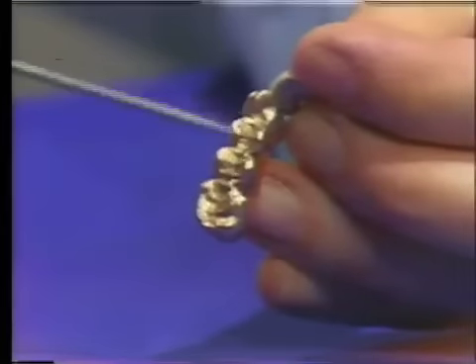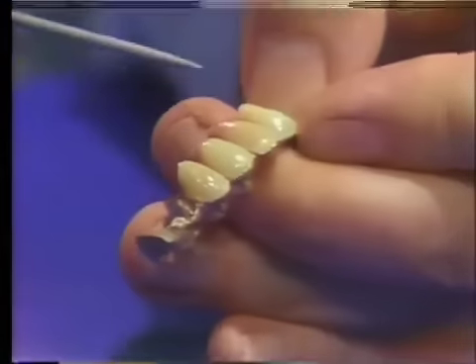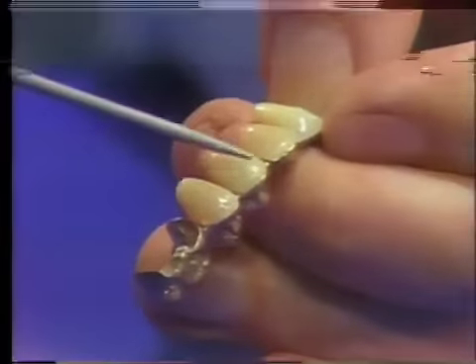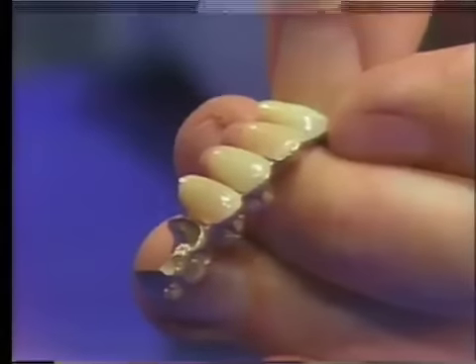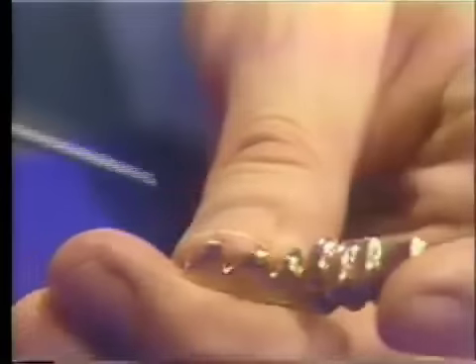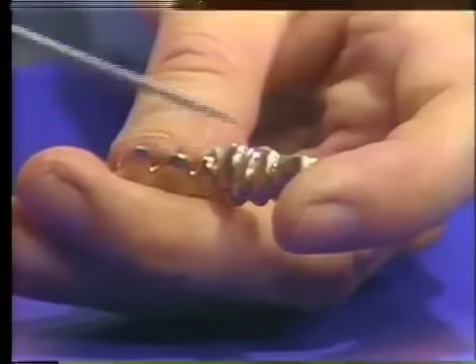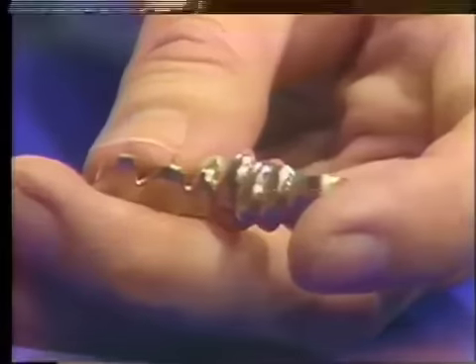You can see, I think, on the occlusal surface of this tooth here that we've got adequate gold protection of the porcelain. You can see, I think, along the labial boundary here that the gold is just visible on the labial surface and protects that porcelain. The fitting end of this has been adapted to give the ridge lap adaptation of this part of the porcelain and gold to the tissue.